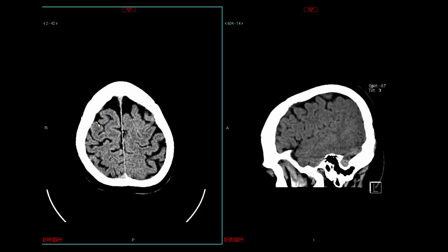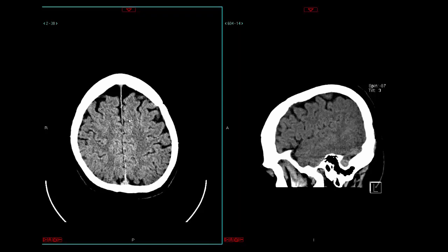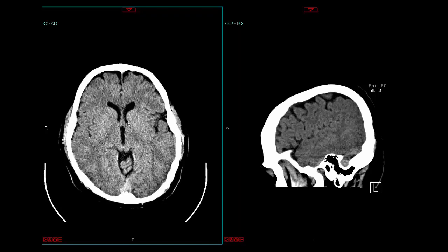Again, on the right, the precentral sulcus here, superior frontal sulcus forming that T shape. Here's that postcentral sulcus forming that T shape with the intraparietal sulcus. Don't forget that mustache sulcus there, which is the marginal ramus or marginal extension of the cingulate sulcus, and so on. So once you get your bearings there, we can go on and get some of the normal anatomy. We'll continue with subsequent modules.